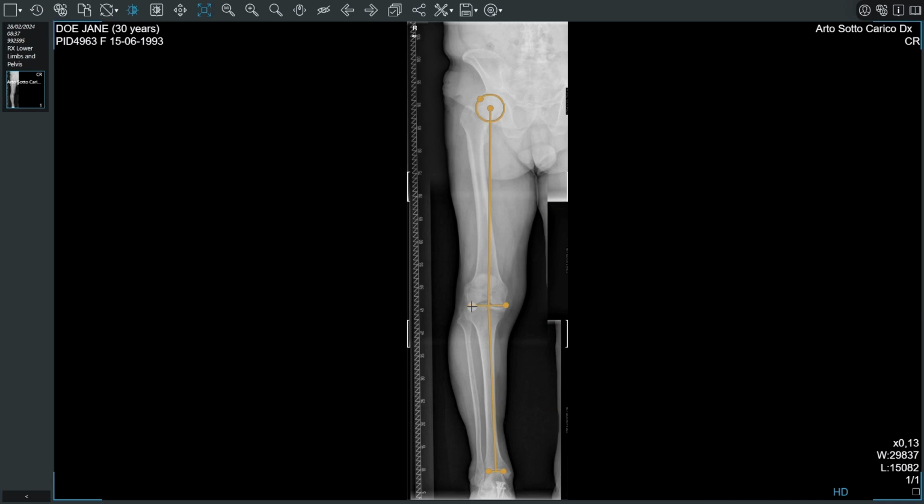To adjust the measurement, click on it and drag one of the segment endpoints or circle markers. To move the measurement, drag it to a new position. Measurements are temporary and will not be saved after the session ends.